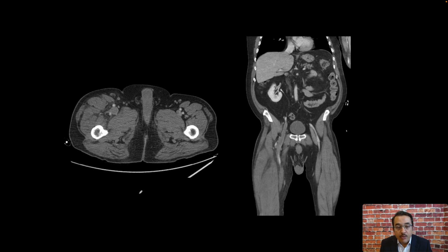On this slide we have two images where the findings are in the vascular structures. Look at normal vascular structures on the left side, normal superficial and deep femoral artery and the femoral vein. On the right side, we find that the arterial structures are fine, but the vein is enlarged and it shows a filling defect. This is also characterized on this coronal image.